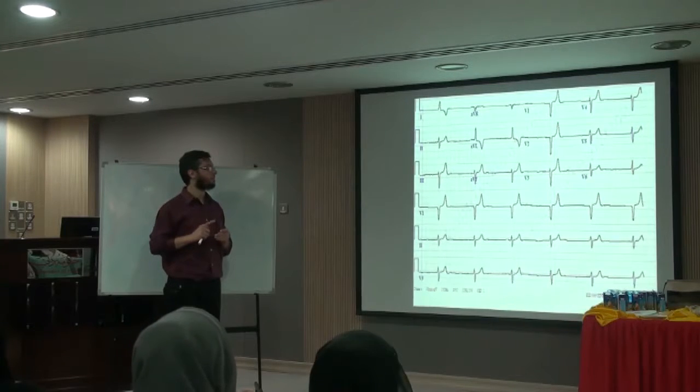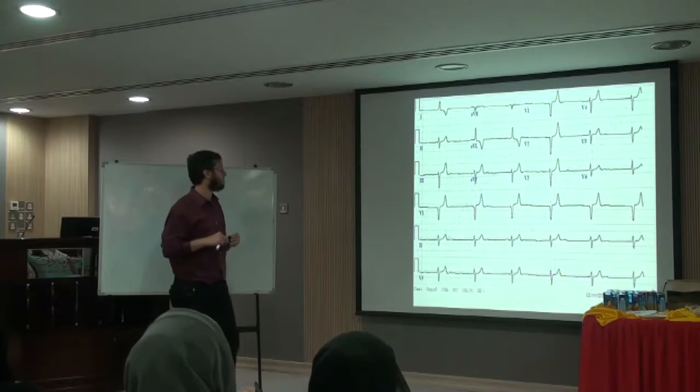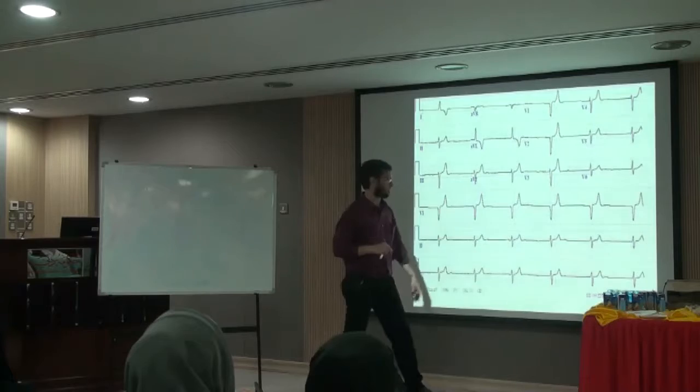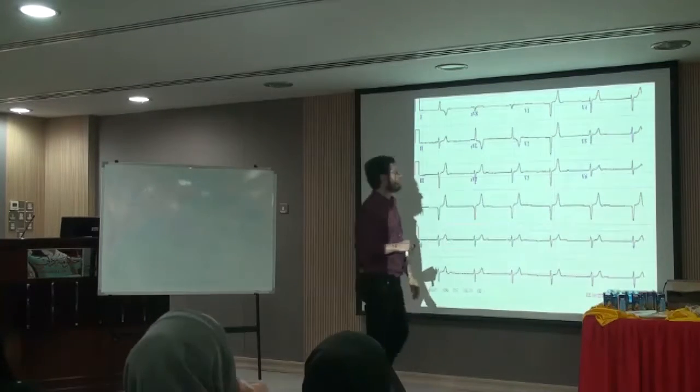There is no relation between P and QRS. But are there any P waves? No. Sorry, this is also a deflection artifact. These are not P waves.